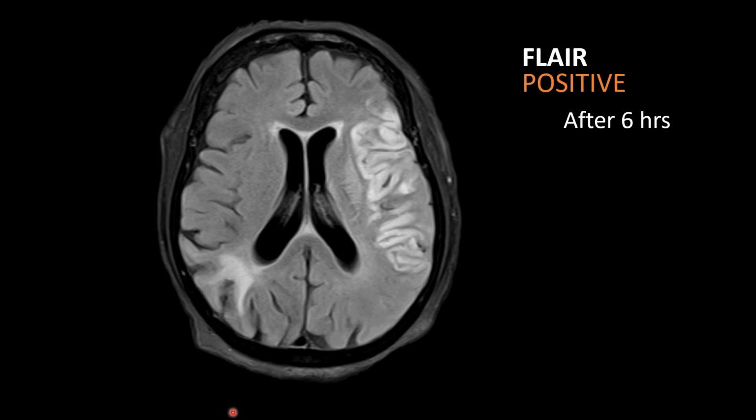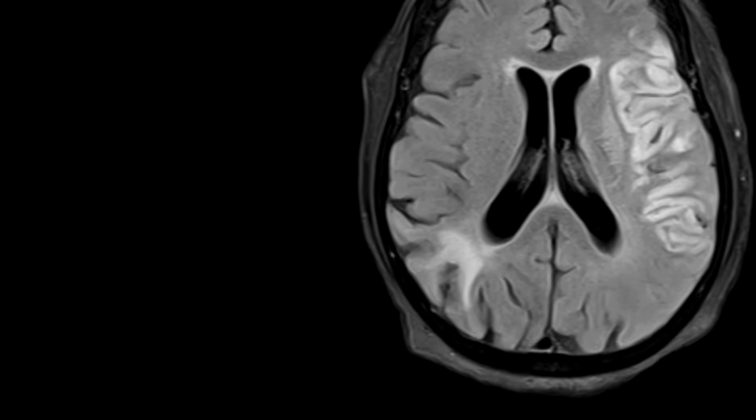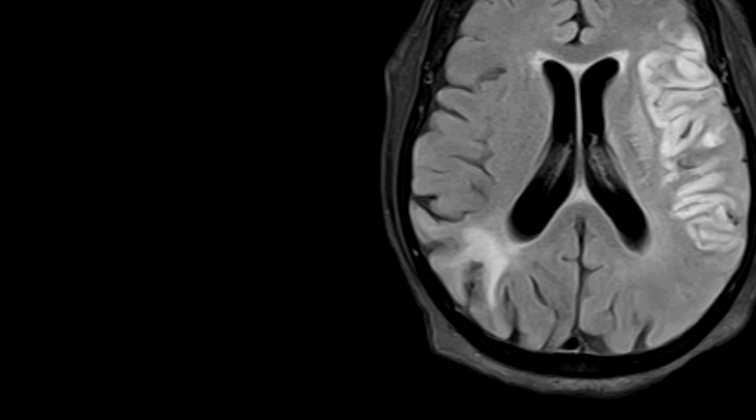After 6 hours, the infarct that we saw earlier has become FLAIR hyperintense. We can also see this FLAIR hyperintensity in the white matter with some atrophy of the gyri, and this appearance is suggestive of gliosis, which is seen in chronic infarcts.